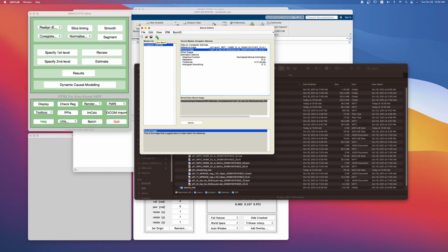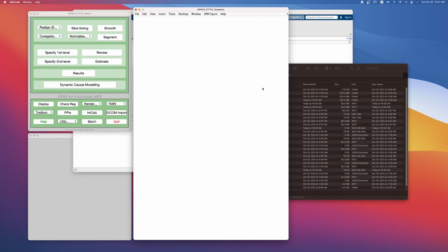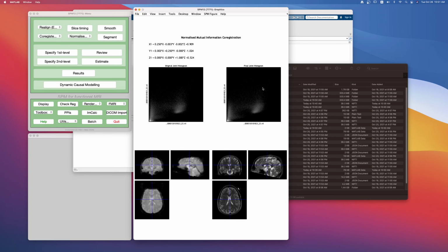You can go ahead and play it. It's really simple. And the key result you'll see is, watch out in this graphics window. Remember, you don't want to close this. Once you close this, it's really hard to get it back. But you're going to need it, so leave it open. I'm going to let it run. Once it's done, you will see this display.